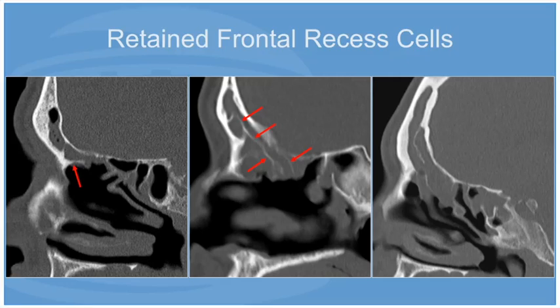Finally, the example on the right demonstrates a large opacified suprabulla frontal cell projecting upward along the posterior wall of the frontal sinus, narrowing the frontal ostium and recess from behind. In all of these cases, the surgeon would want to clear out all of these septations in order to reestablish patency of the frontal ostium and frontal recess.